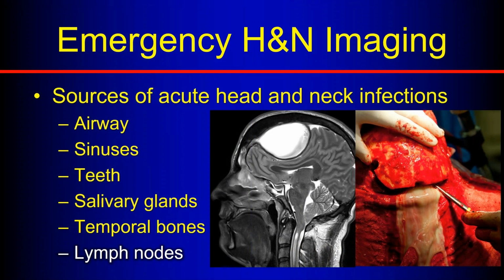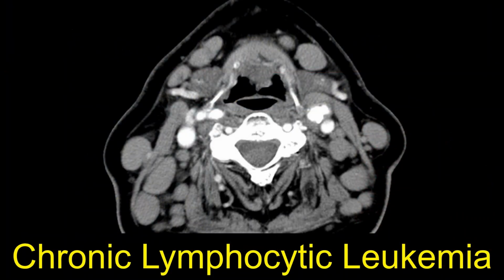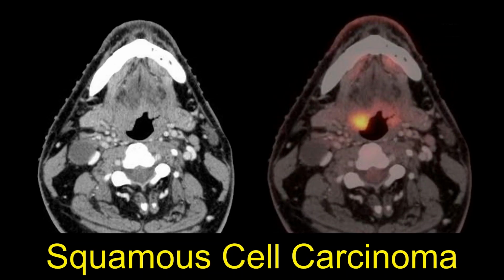So lastly, to finish up, we have lymph nodes. Often we see big, positive, solid lymph nodes all over the place if a patient has a lymphoproliferative disorder, lymphoma, leukemia, CLL, ALL, one of those. So these are big, solid lymph nodes that are all over the place in the cervical soft tissues. If we see low density, though, we sometimes think about cancer and squamous cell carcinoma specifically.